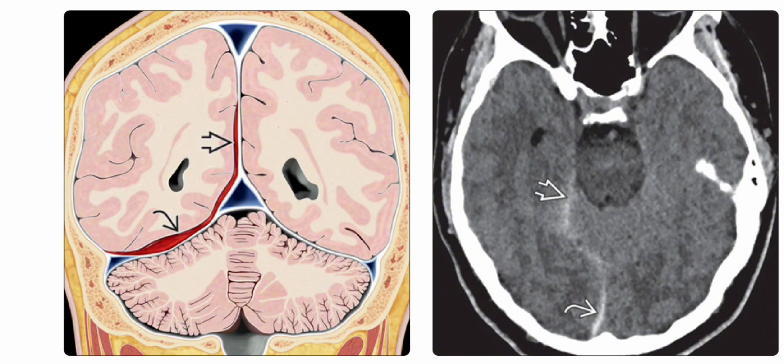So continuing with the acute subdural hematoma cases, left is the coronal graphic, which depicts a thin acute subdural hematoma layering along the falx and tentorium. Such acute subdural hematomas may be difficult to identify on axial images alone. Multiplanar reconstructions are very helpful in identifying small, thin acute subdural hematomas. Right is the axial non-enhanced CT scan in a 31-year-old man with minor trauma, and it shows subtle hyperdensity along the tentorium and the inferior falx near the confluence of the venous sinuses.